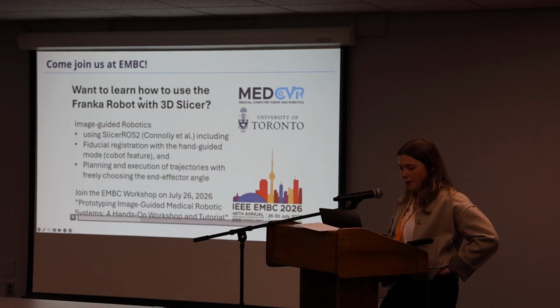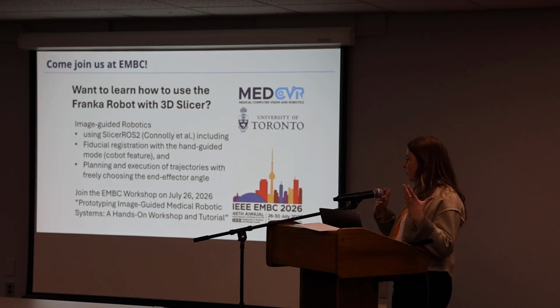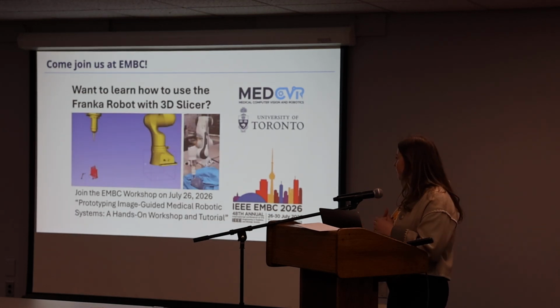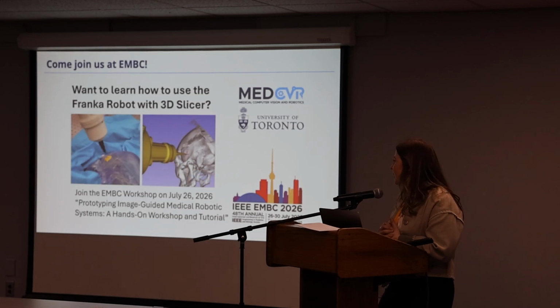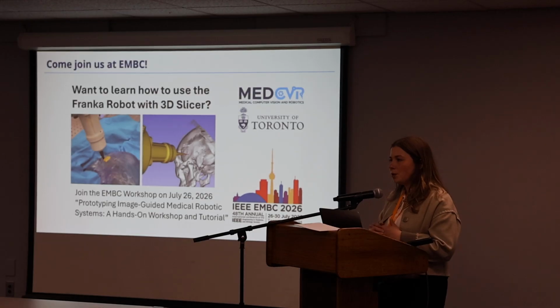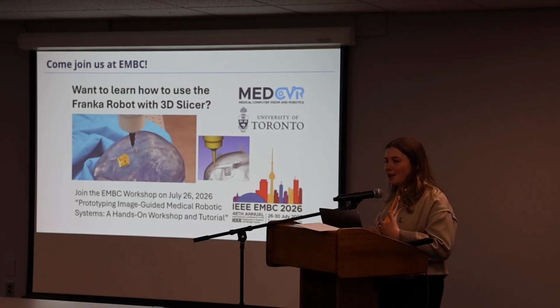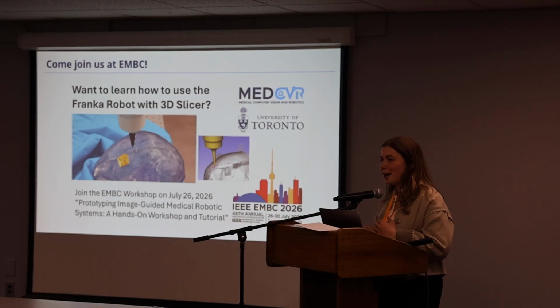Is the video still playing? I think they have a couple of examples, but they'll take surfaces that they extract from meshes, from segmentations, or fiducials, and they can get the Franka to actually follow. In our experience, people will typically take SlicerROS and then build their example application on top of it. But with this motion control, it's our first time trying to add generic tools that are not just loading a robot and publishing and subscribing.